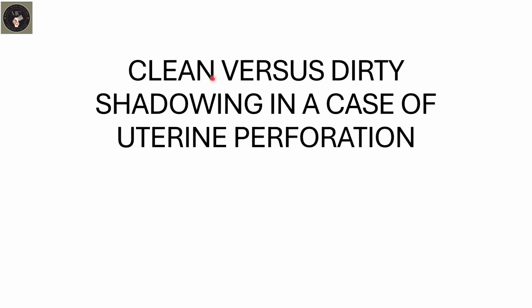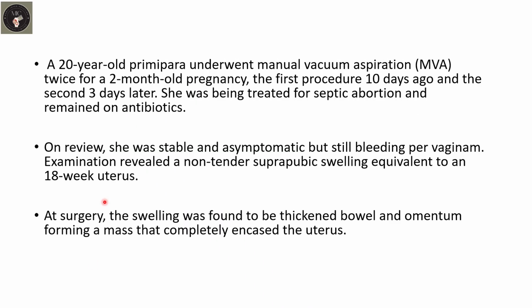Clean versus dirty shadowing in a case of uterine perforation. She was a 20-year-old primipara who underwent manual vacuum aspiration twice. The first was 10 days prior to presentation, and the second was 3 days later. She was being managed as a case of septic abortion, and she was on antibiotics.